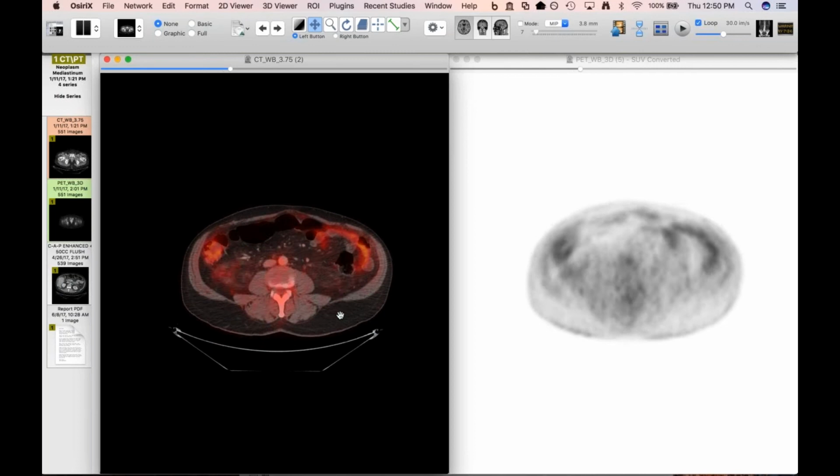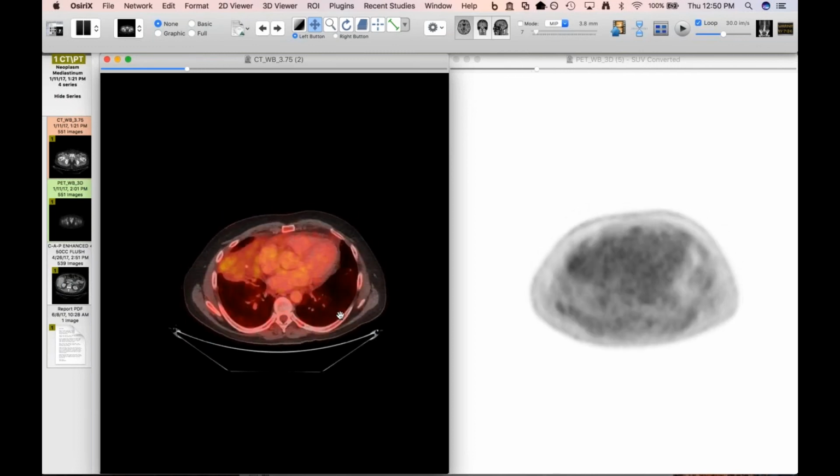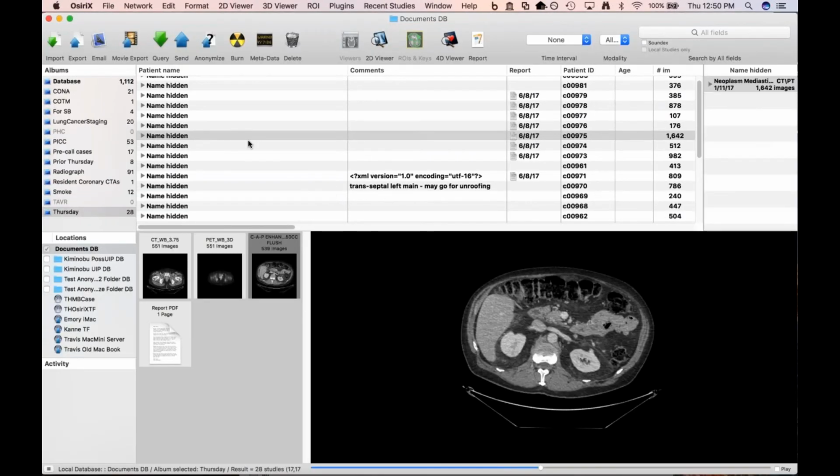Huh. So, yeah, amyloid deposits. Wow. Yeah, I thought that was a cool one because I know others have shown amyloidomas before, but sometimes they seem to be more discrete with more calcification, but it's actually ossification often. Is it ossification when you see it in the lungs too with amyloid? Yeah. Okay. Bone. All right.